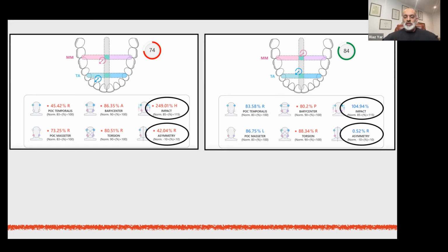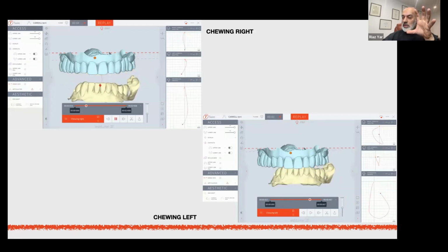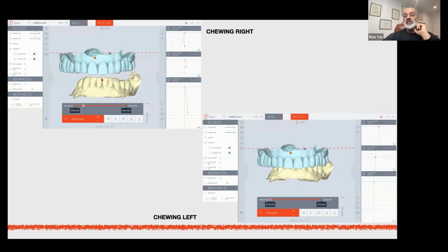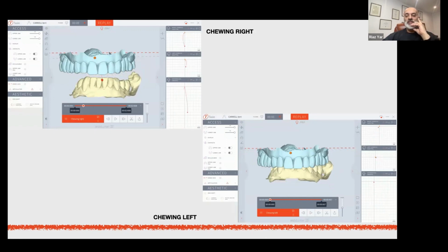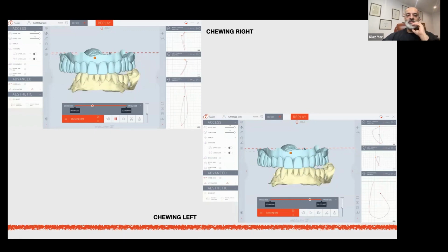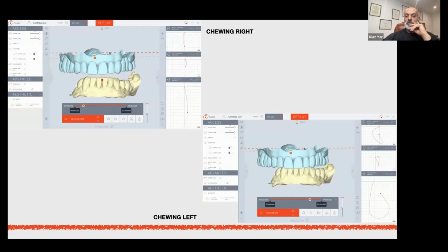So what I've tried to share with you in the time that I've had is, how do we improve our patients rehabilitatively? And if you look here, look at how her chewing has improved on the left, and the right still vertical, still protected because she's got missing teeth on the right. But her left has really improved. So her left side is much better, whereas the right side is still protected, still guarded. She doesn't like chewing on the right, but that's because she doesn't have any teeth on the right to chew properly with.